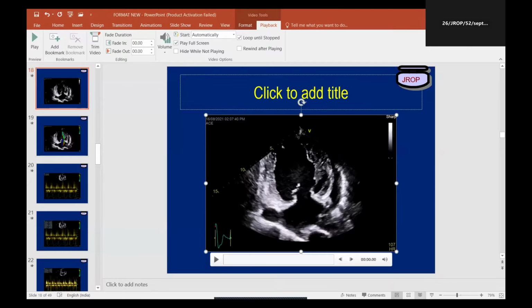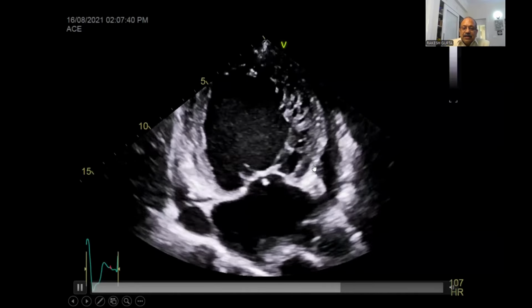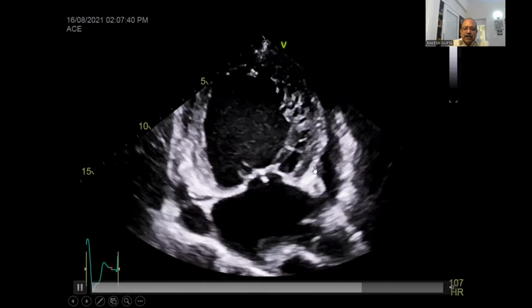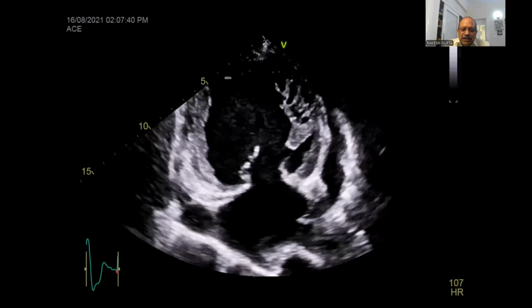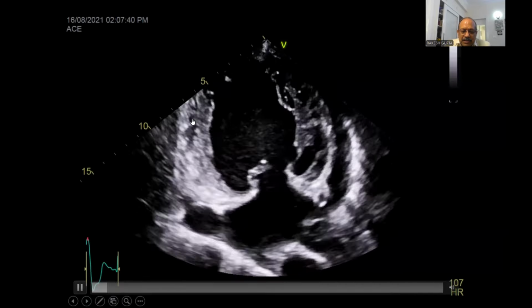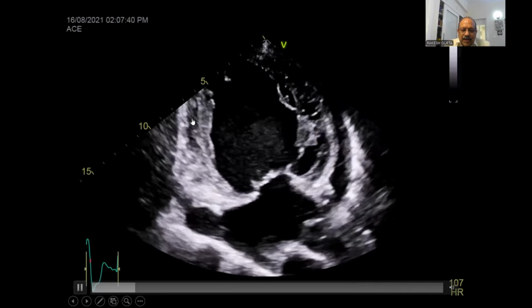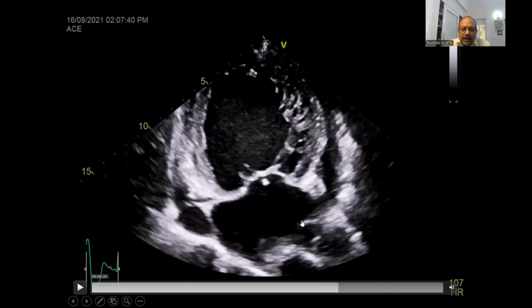Yes, sir. Now look at this, focus on this basal lateral. This is basal inferior, anterior wall. This is lateral, basically some combination of anterior plus inferior, because I could see the papillary muscles. I could see some tricuspid, RV over here. So this is possibly a basal lateral wall. Let me stop it for you. Correct. Now you measure this thickness from this point to this point, and this is in systole.